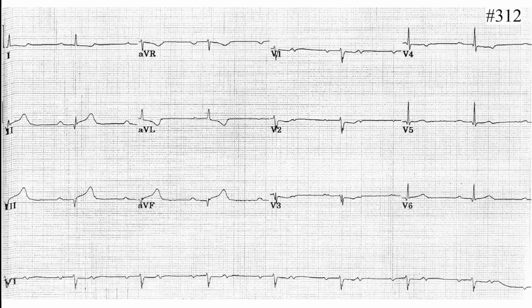See, this is why it's good to speak up for everybody, because nobody is going to present everything immediately. So it looks rhythmic to me, looking at the bottom. That's rhythmic. And so then the heart rate, I can't really see the 1, 2, 3, 4, 5, 6, a little bit more than 6, so it's less than 50, so it's around 45. Yes. So it's bradycardic.